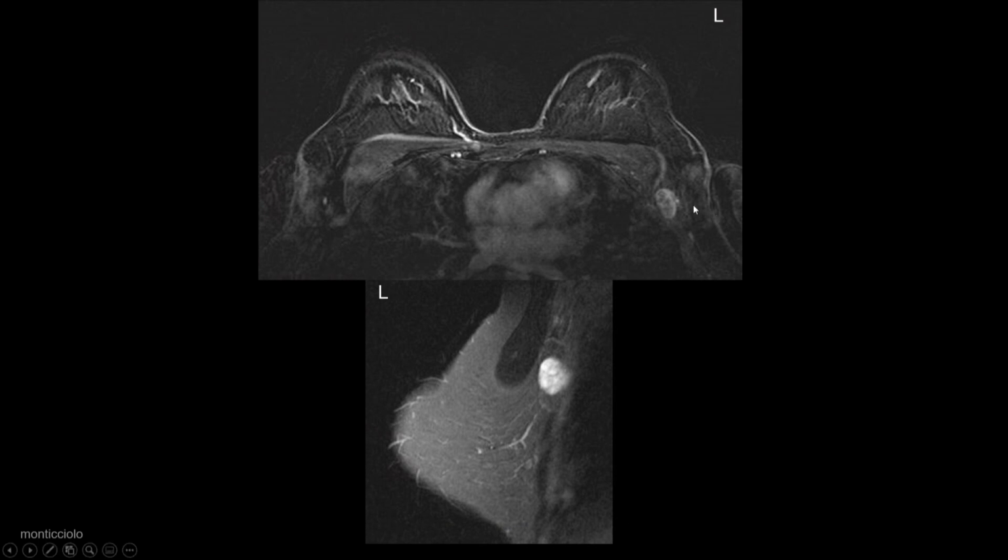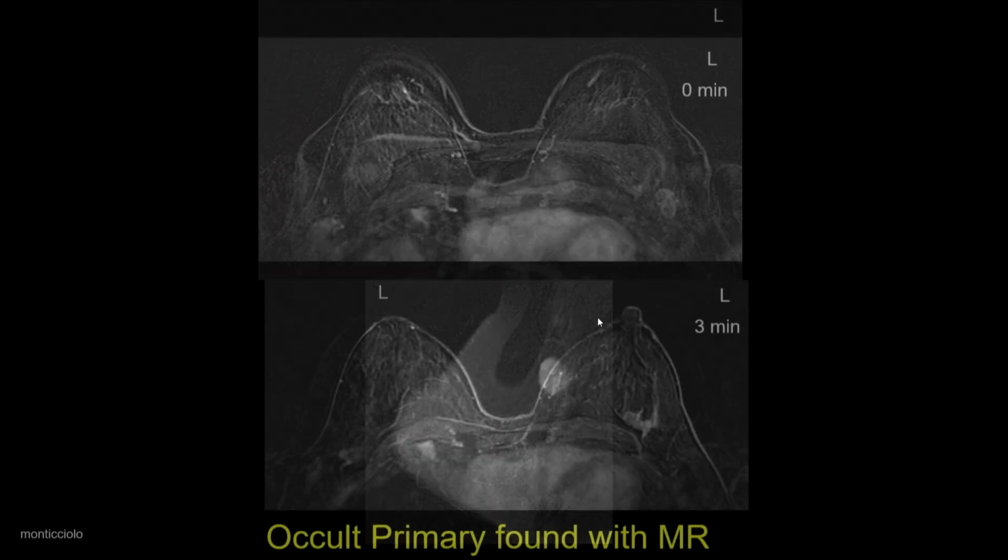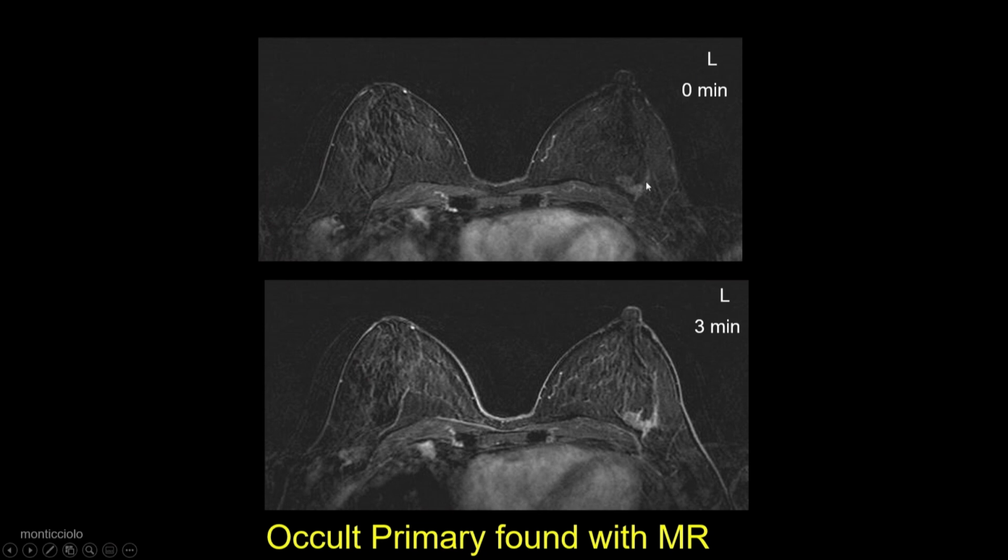You can see the node here. This is the sagittal projection, and there's the node. And then here, close to the chest wall, in approximately the 3 o'clock position of the left breast is the tumor, not seen because of the dense tissue.